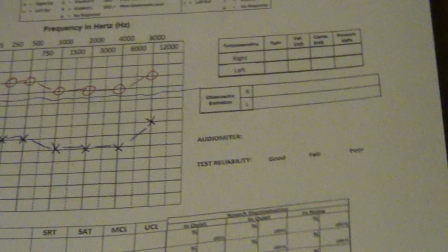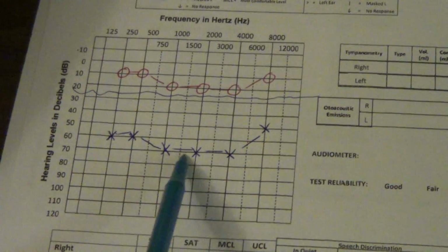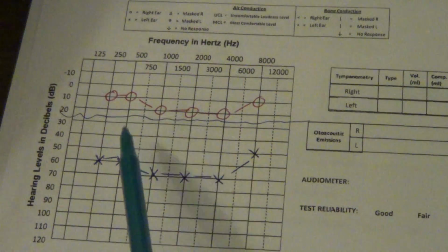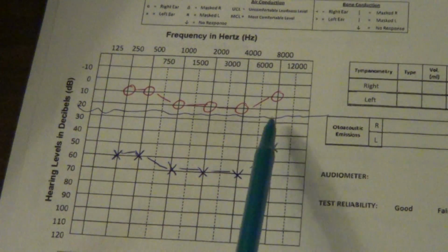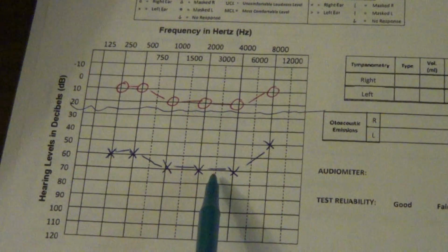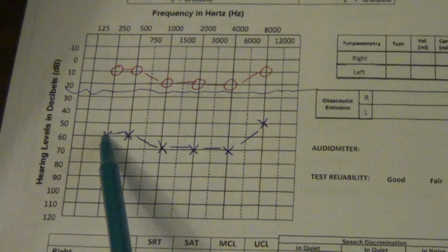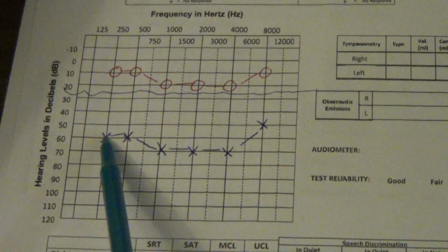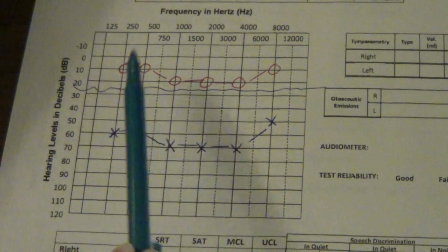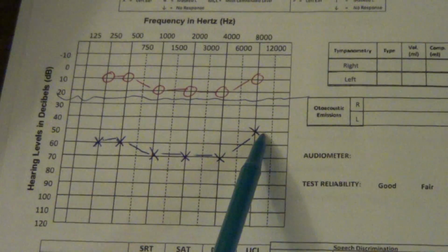Well, if you look at this audiogram, you'll notice the left ear takes on almost the same pattern as the right ear. What can happen when you have this much of a difference between the ears is that the good ear will actually cheat for the bad ear. So the signal can actually get loud enough when you're trying to test the bad ear that it crosses through the headphones and is actually heard by the good ear, and the patient will respond. This is called a shadowgram because they look very much alike.